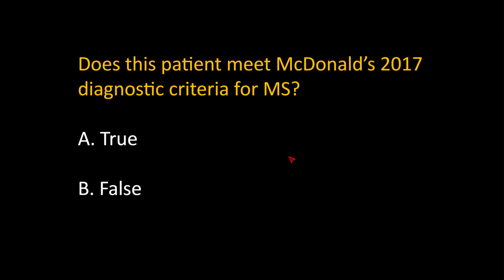And as I'll talk about briefly, with these cases of partial transverse myelitis, the possibility of something like an infection being the etiology is extremely uncommon and sort of undetectable in series. So that's why it's important when you see these cases with focal cord lesions to recommend and get a brain MRI, because you can actually diagnose somebody with MS without delay based on that single time point.